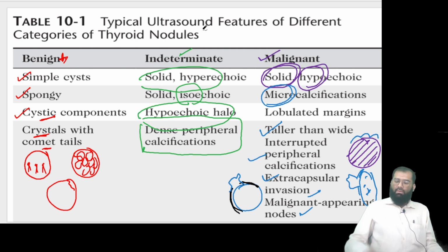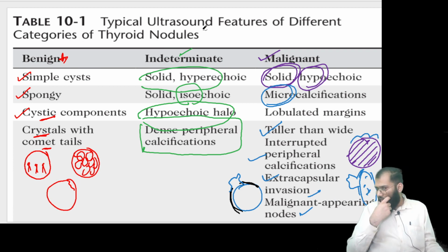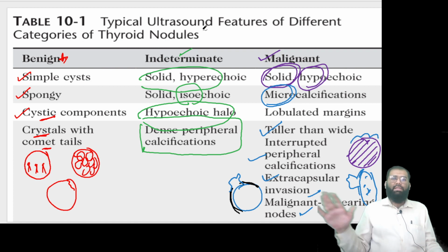Of course, you have to look for all those malignant features to rule out malignancies. Also look for lymph nodal metastasis and other organ involvement. Okay. Hope this clears up features of follicular, papillary, anaplastic neoplasms of thyroid, and also about thyroid gland lymphoma. Hashimoto is a very important risk factor for thyroid lymphoma, which you must always remember.